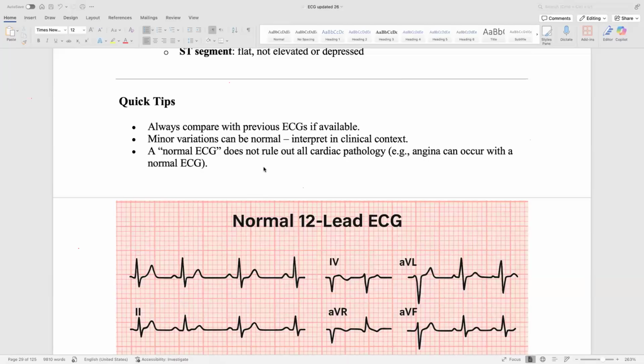If it is there, alhamdulillah, no problem. You can just relax, or you can link it. You can depend on the clinical presentation right now, not on the ECG only. But if it is not there, you will raise the suspicion. For example, left bundle branch block. If the patient has an old bundle branch block, the same as the ECG you have right now, that means this is mostly an old bundle branch block. And that is the difference, because a new bundle branch block is an ST elevation MI equivalent.